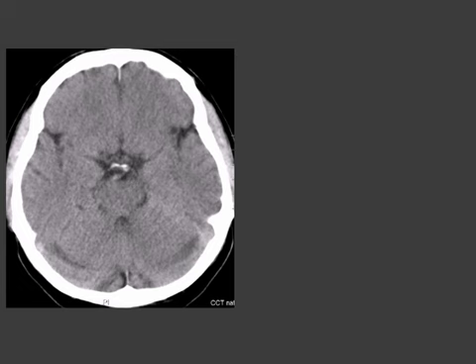They are not always looking like that. Sometimes they're very subtle, and sometimes the piece of a basilar artery that is obstructed is relatively small. If you look at this case that I will show you, it's really tough to say if something is wrong with this basilar artery. And if you're in doubt, never hesitate to proceed to CTA. Either it's nothing or it's something.